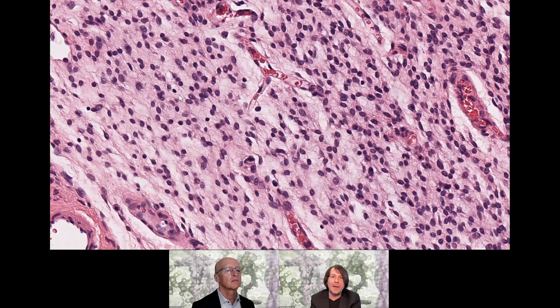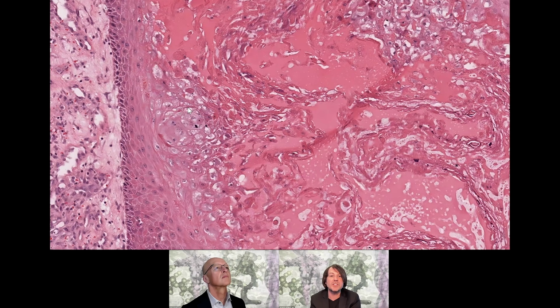I saw a case a while back that we were pretty sure was ORF, but it had tons of neutrophils in it and looked almost like Sweet's clinically and microscopically, but had tons of edema and long, thin, reedy rete ridges. But it was on the scalp of a little kid. And it turned out the little kid had been to a goat petting area just a couple weeks previously, and his head height was about the height of a goat's mouth. And goats love to chew on everything, including hair. So we postulated that.